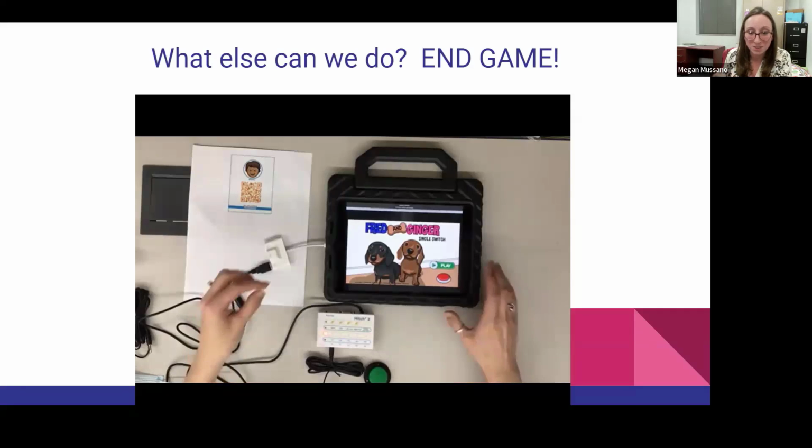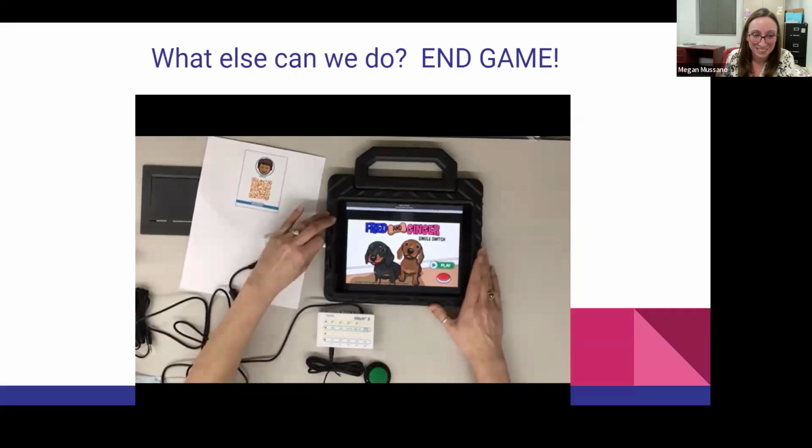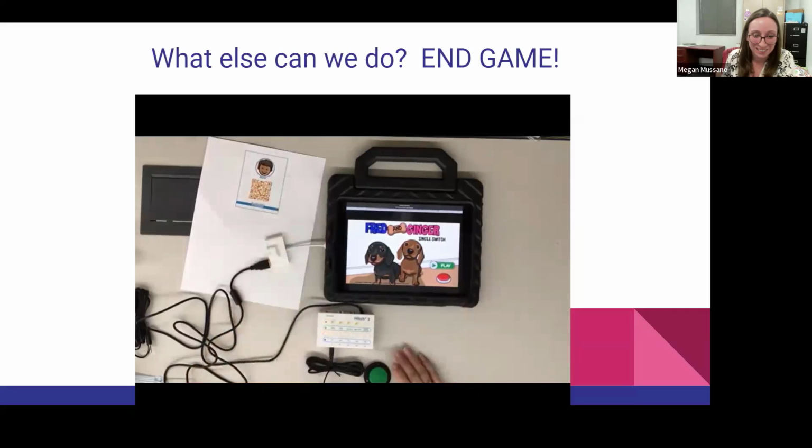I left this in on purpose. If there is an issue, feel free to unplug the switch and replug it in, which is the best way to troubleshoot any issues with the switch control. And then it worked that time.